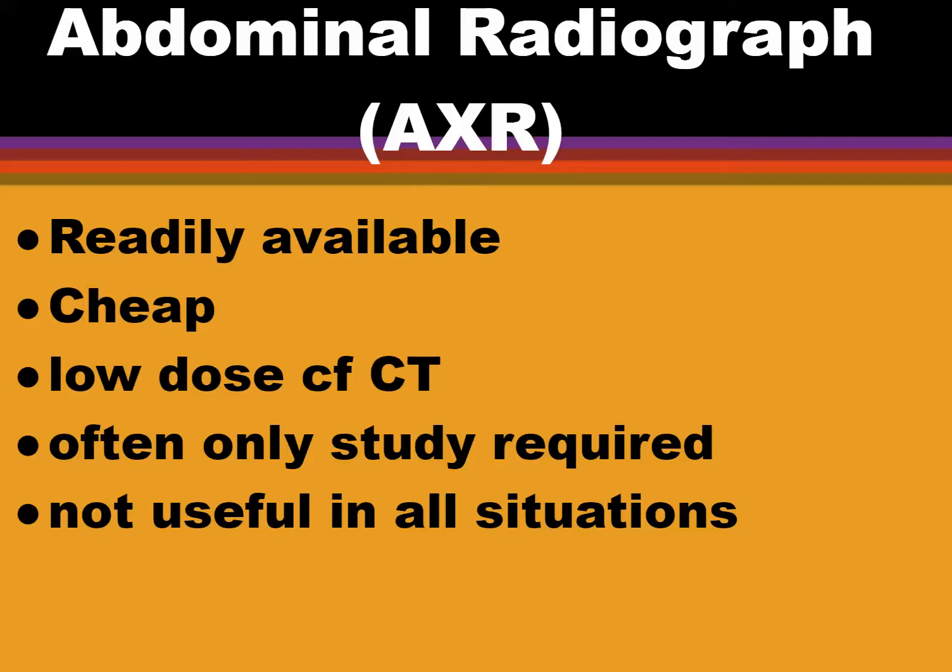It shows the soft tissues, but not in any way near the detail that a CT or an MRI would show. And if the patient's stable enough to go to CT, I think that's what is normally done these days. A patient goes straight to CT.